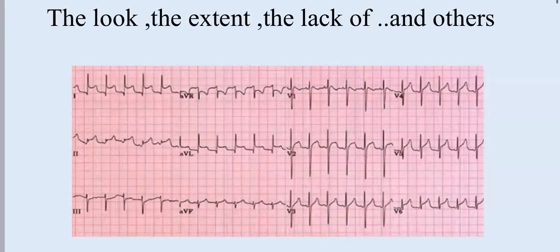Now, what is this? Anybody? Any courageous somebody? Pericarditis. Okay, it looks saddle shaped. Saddle shaped. No, not pericarditis, this is ST elevation MI.